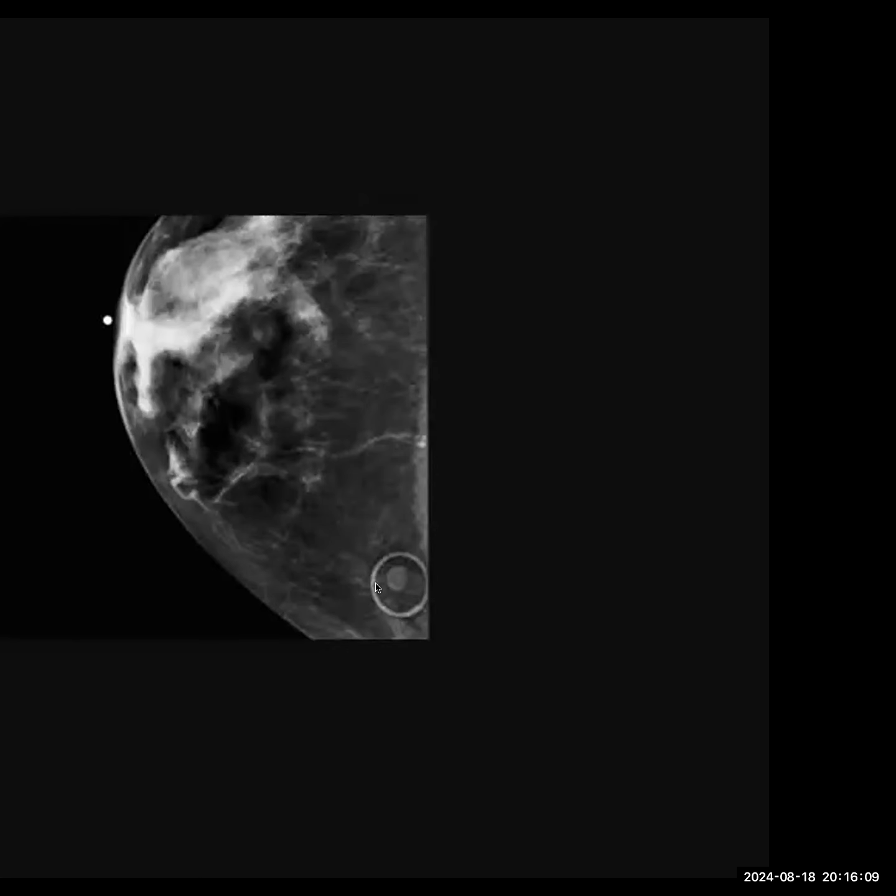I'm not sure. You're asking me or you're telling me? I am telling. I'm not sure. You can tell me whatever you feel is right. So I think that there has been a procedure in this region, and a marker has been placed to identify the region during imaging to correlate findings.